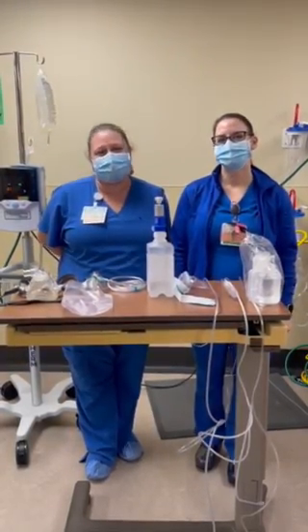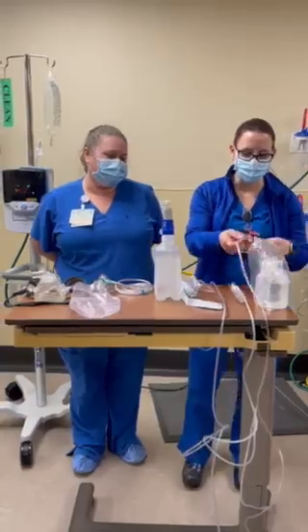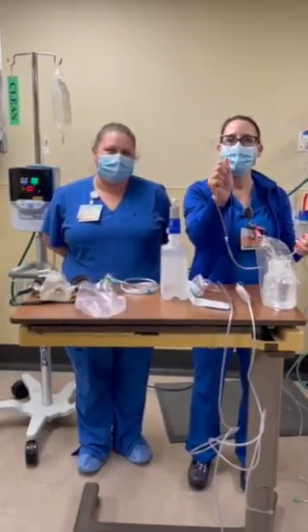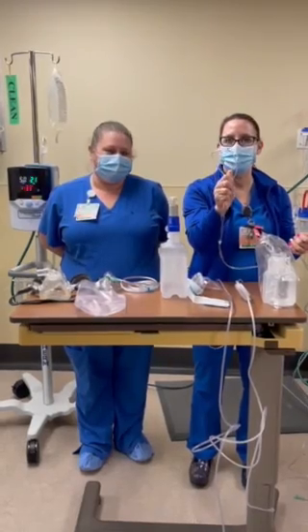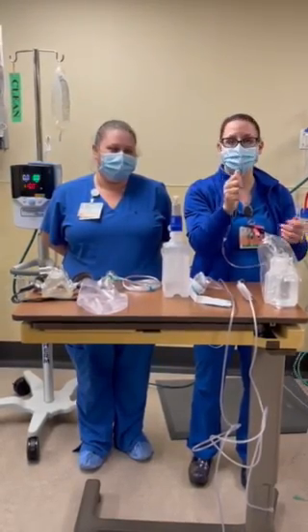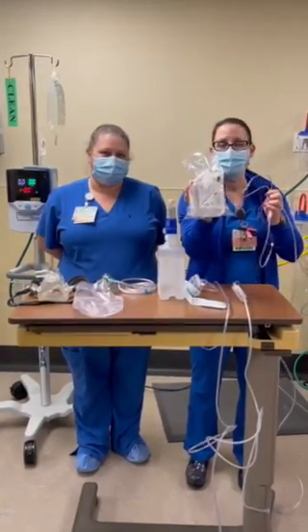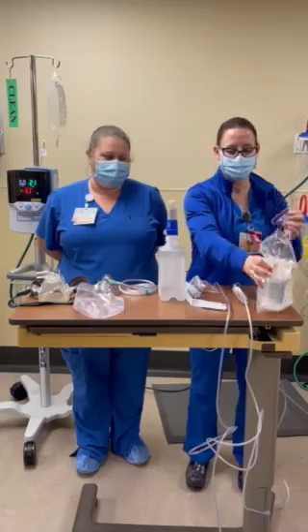We're going to be discussing oxygen devices. Okay, first up, you have your basic nasal cannula, max flow 6 liters per minute. This is also the only device you can hook up to a bubble humidifier. The only one. Nothing else gets hooked up, okay?